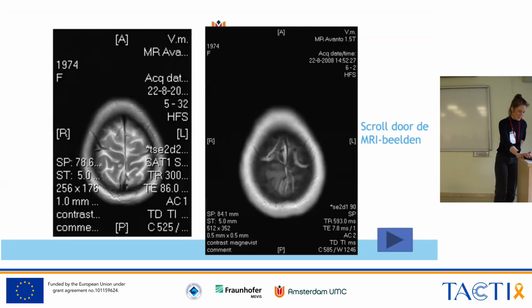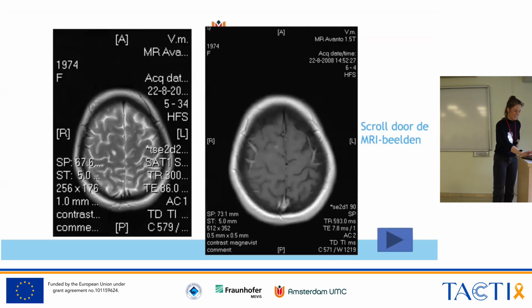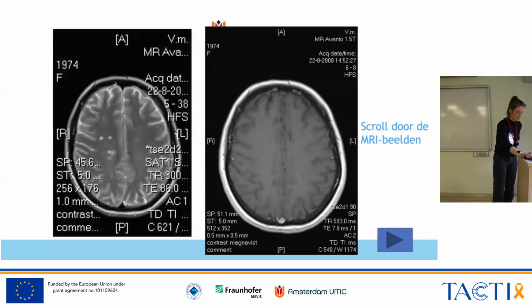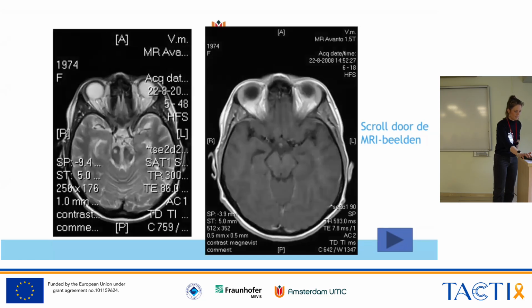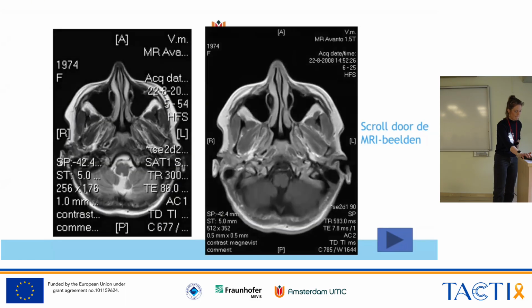So these are the new images. Here, the contrast on the right, and the T2 on the left. You should have given her Tysabri. Yes, we should have done that.